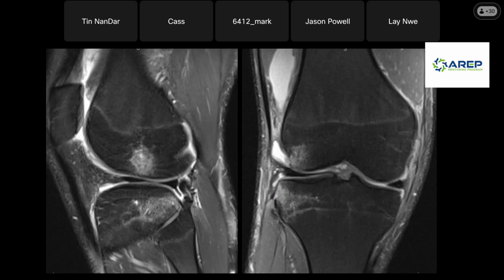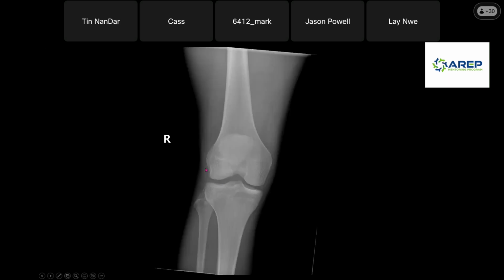And so this structure is now looked at specifically on the MRs sometimes to see if it's intact, because if this anterior lateral ligament is disrupted, then they have less stability in their knee joint. I don't know that they're doing anything about it surgical wise, but it's just another indicator. And that's what happens on the X-ray: that anterior lateral ligament comes here and just kind of pops that off at the shift.